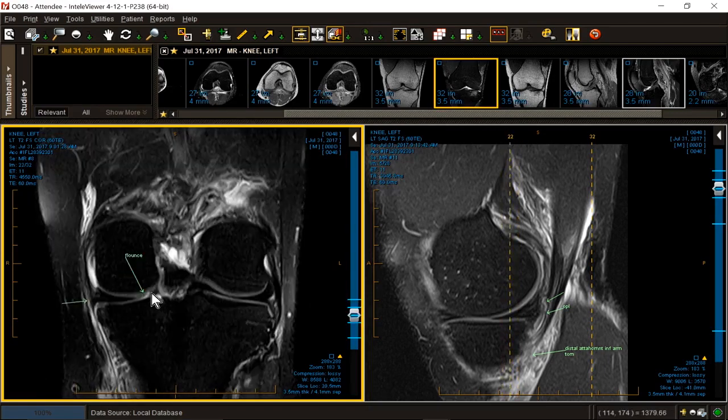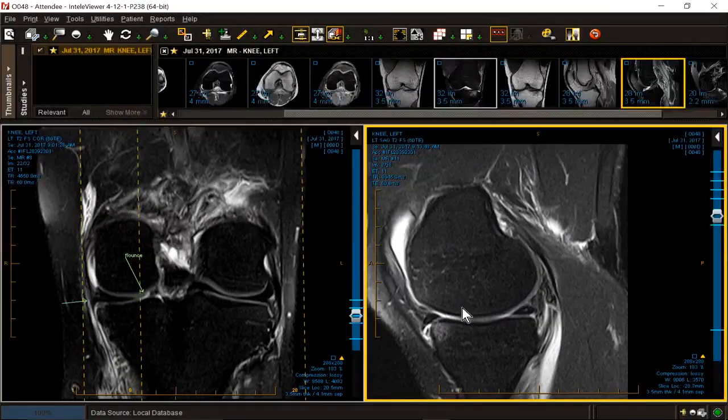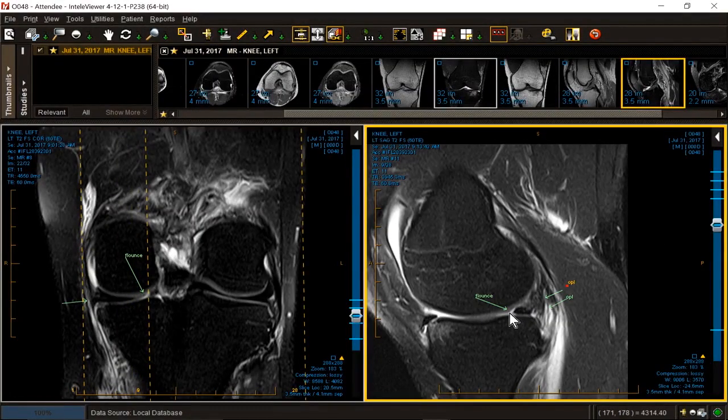The signal that you're seeing here is simply waviness of a hypermobile meniscus due to the loss of its tether at the root, and that is called meniscal flounce. So flounce is really a meniscus free edge that is wavy and is surrounded by a little bit of fluid and a little bit of synovium. If you look at it sagittally, it'll have a smooth edge to it, and you won't see any meniscus inside it. It'll be only on the free edge.